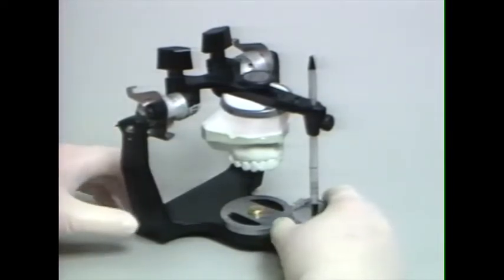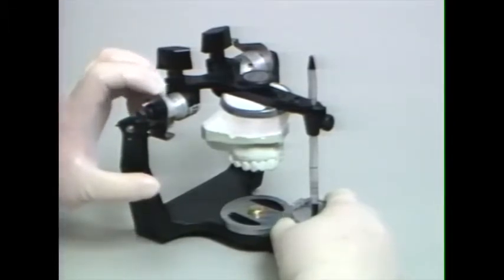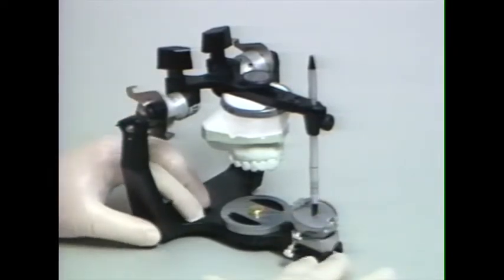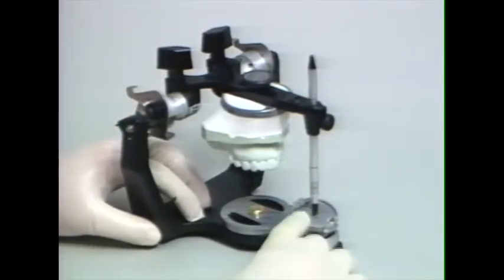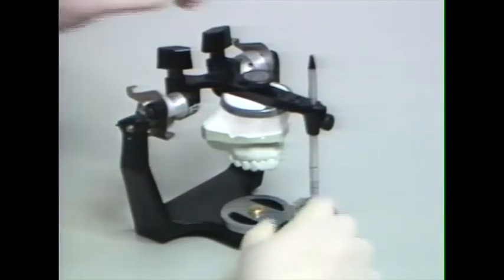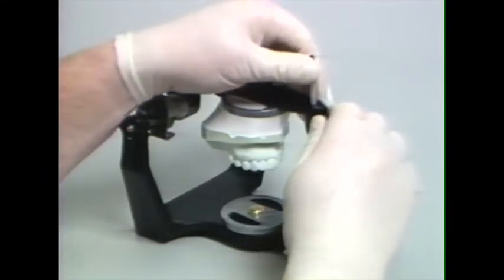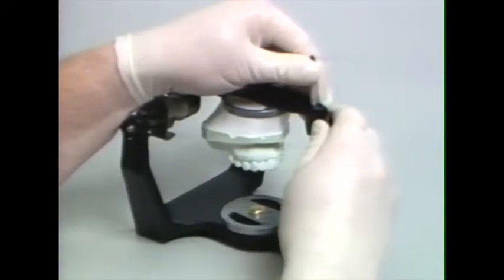To prepare the articulator to mount the mandibular cast, we need to continue to have the articulator locked in centric relation. We set the incisal guide table so that the mark on the incisal guide table is even with the incisal guide pin, and we need to set the level of the incisal guide pin. If we are mounting at the correct vertical dimension, the same vertical dimension as the record, we need to set the articulator even with the large ring on the incisal guide pin.